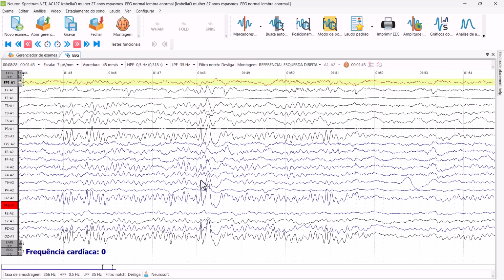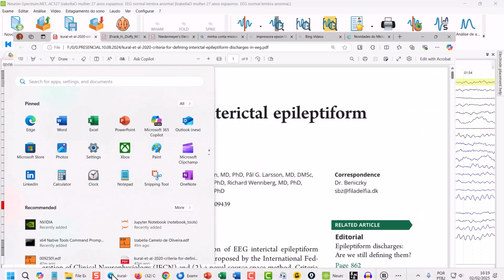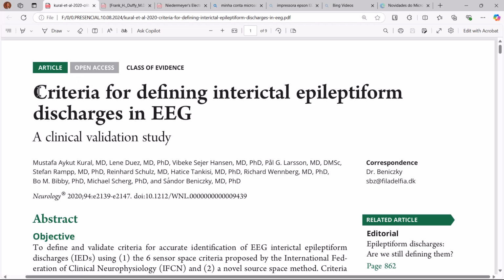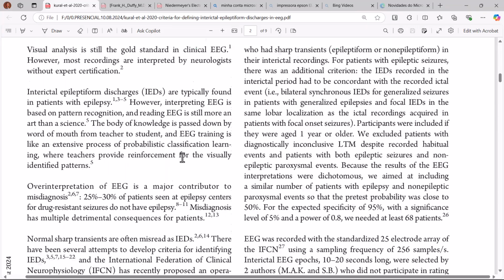So this increase in power also pushes this alpha higher. It increases the amplitude of the alpha as well. Then you return to the normal alpha rhythm, and then the person becomes drowsy. Periods of drowsiness are more likely to present sharp waves, it's true, which is why these normal findings confused us. There is an increase in spike activity in somnolence.